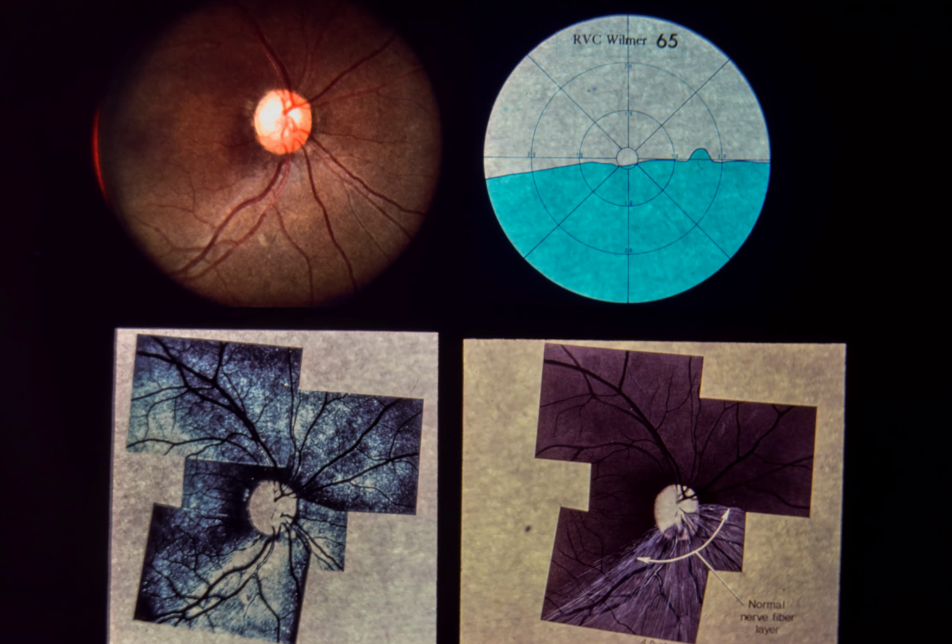Upper left. The right optic disc shows superior temporal pallor with extensive loss of the superior nerve fibers. The inferior nerve fibers are easily seen as diffuse, radially oriented striations. Superior retinal vessels are seen in sharp detail due to loss of overlying nerve fibers. Upper right.